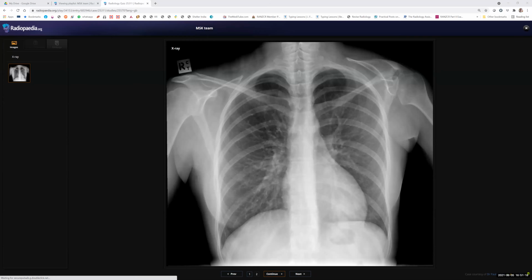Then this one also is a benign incidental finding. When you describe it as an aggressive lesion, the film will go down. It's a Sprengel deformity. You have to say there is an elevation of the left scapula in keeping with Sprengel deformity. Then I am checking for any omovertebral bone. There is no omovertebral bone. I am also looking for any associated vertebral anomalies, and I am not seeing any. So I'll compare with previous films, and if it is stable, then nothing to do. Okay.